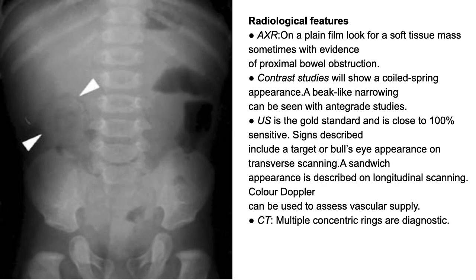So the radiological features. When you request an abdominal X-ray, you have to look for a soft tissue mass with this target sign. But ultrasound is the gold standard and is close to 100% sensitive.